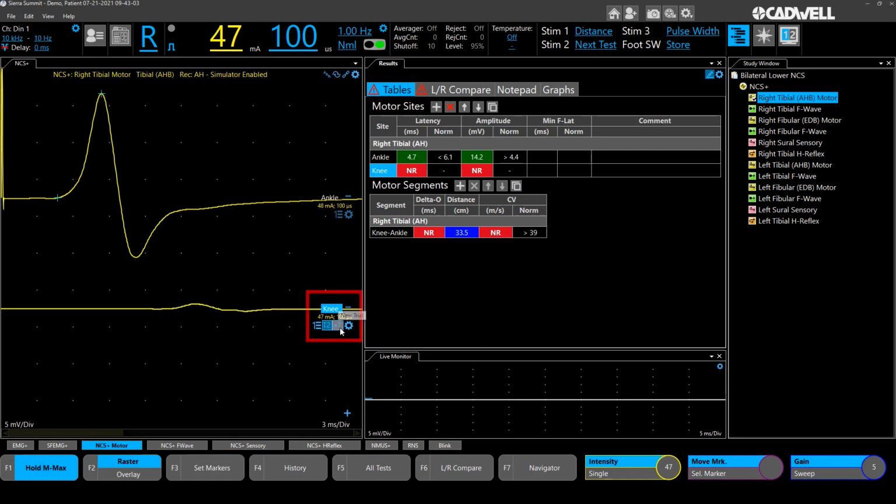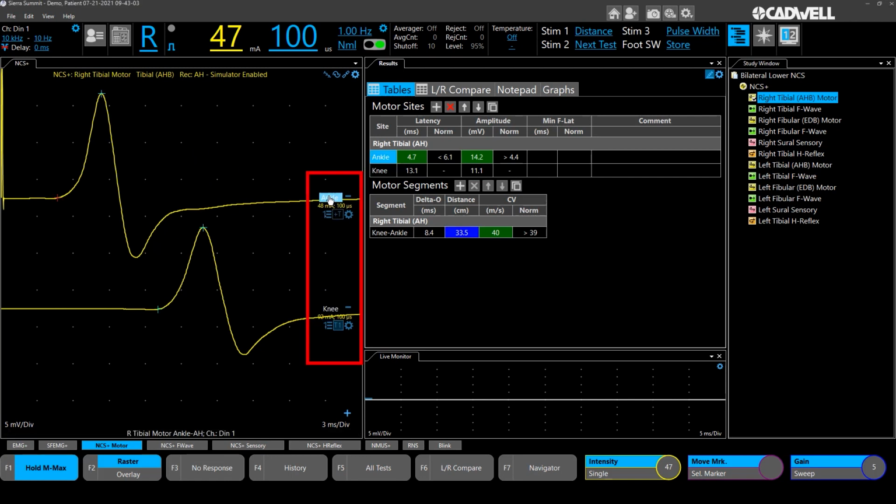Now you can add a third trial or fourth trial, or by pushing the T2 button, you can compare your two trials and pick which one you like the best. The red is the selected trial. When reviewing through the data, you can see which traces have more than one trial because the T1 button will be shown and highlighted. Pushing the T1 button allows you to see both trials and compare the two. Only the selected trial will be printed out.